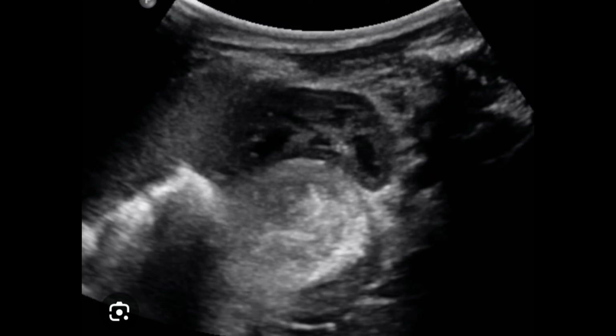Another clear example of the neuroblastoma. Here you can see part of the kidney is visible to you, while the inferior portion in this image has been occupied by the neuroblastoma, and it's coming inferiorly downward. Eventually it will encase the abdominal vasculature. As far as the mass is concerned, you can see it's slightly hyperechoic, but there are no cystic degenerative changes within it.